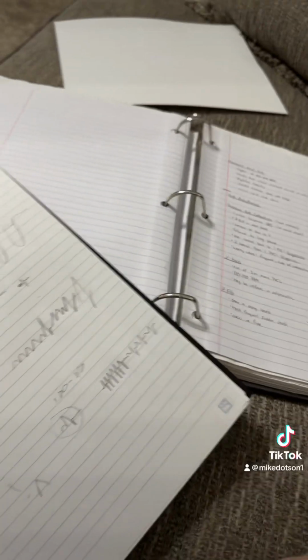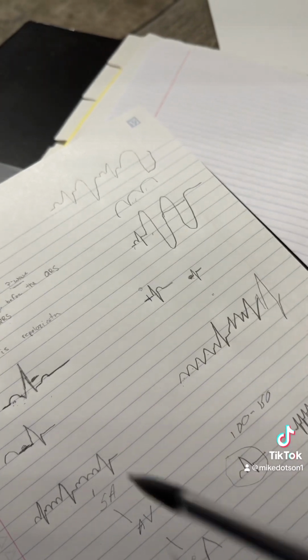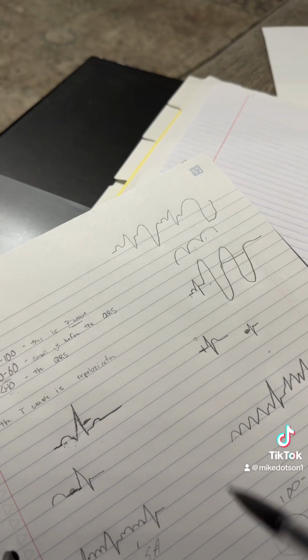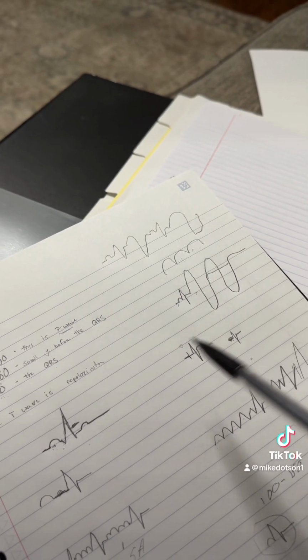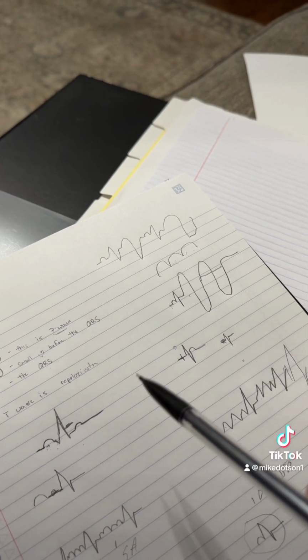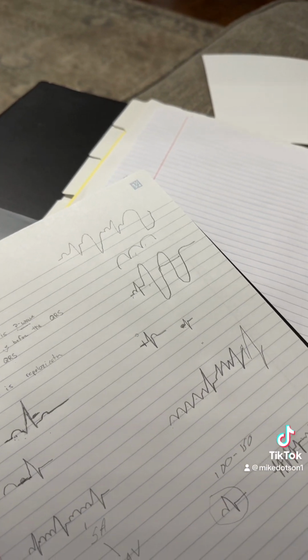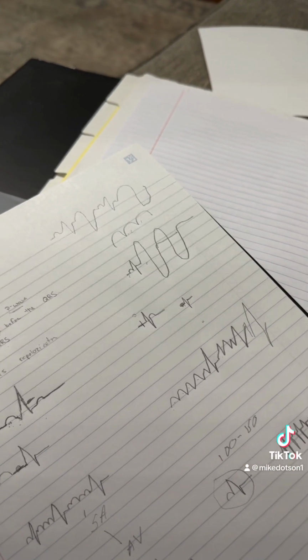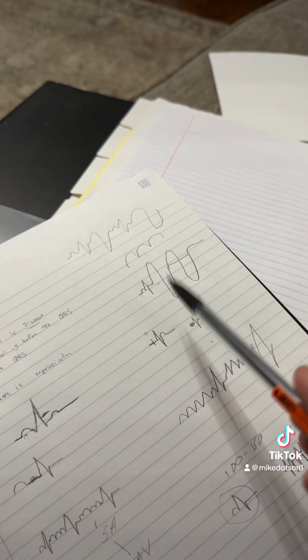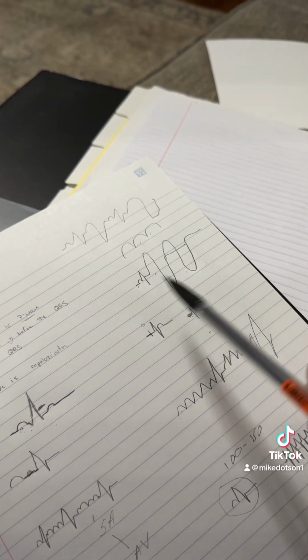Now, I mentioned those triplets before, which is three. If you see any more than three, that becomes VTAC. It can be a run of VTAC. It can be sustained VTAC. Regardless of the case, anytime there is a run of VTAC or sustained VTAC, go check your patient, notify the provider, whatever be the case right away. That's something that needs treated. The patient cannot perfuse in ventricular tachycardia. Always check for a pulse. I've had multiple patients that have been in ventricular tachycardia look at me and talk to me and be stable, but they're not going to be stable long if they are in VTAC.